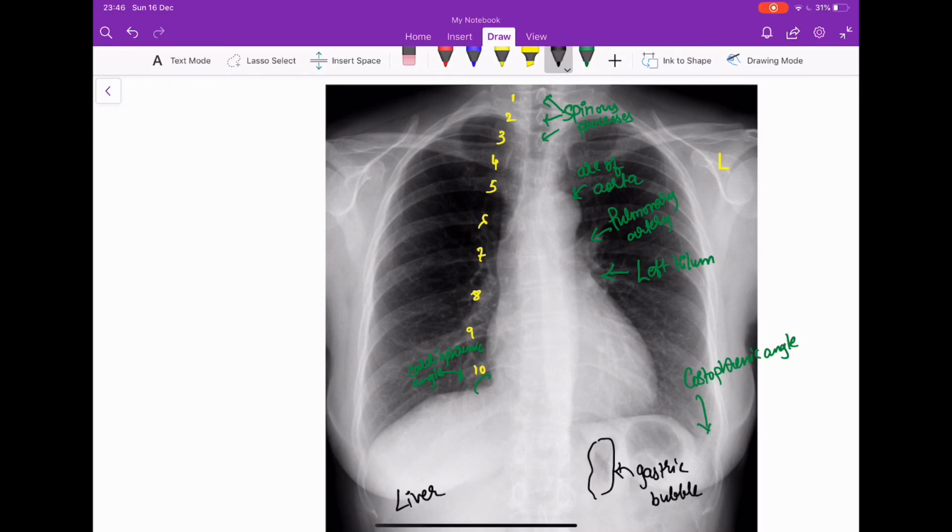After that we will try to determine the atriums and ventricles of the heart. Starting off with the left ventricle, above it will be the left atrium, on the opposite side the right atrium, below it corresponding to the vertebral column there will be the right ventricle, and below them there will be the para-aortic line. And also on the right side there will be the right hilum once again.